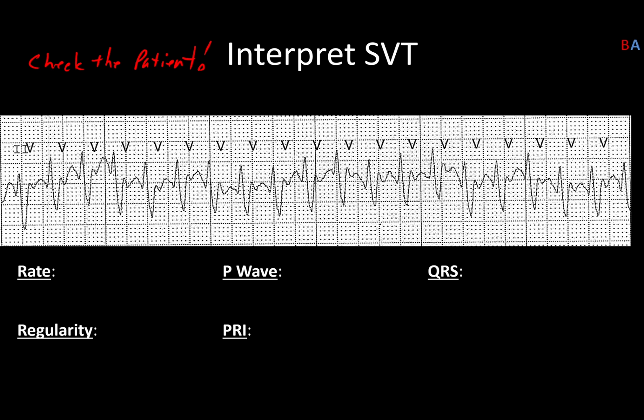And I'll talk more about this patient's history, but first, let's go ahead and pick this one apart, shall we? So we'll switch colors to green here, and we'll number them off. Now, this is a 6-second strip. And while you're looking at this, you can tell that it's pretty regular. There's no ectopic beats. They all pretty much look the same. They look pretty ugly, actually.